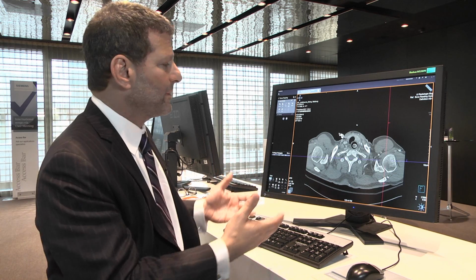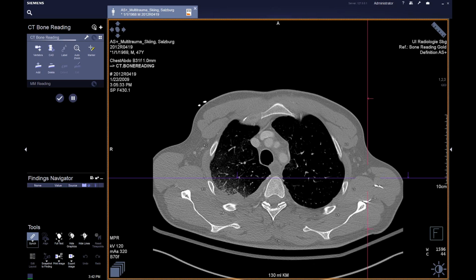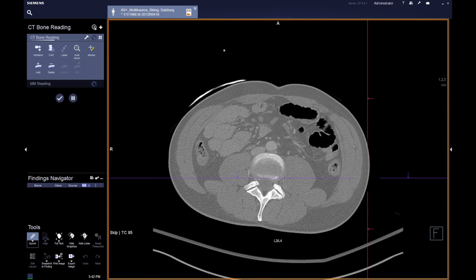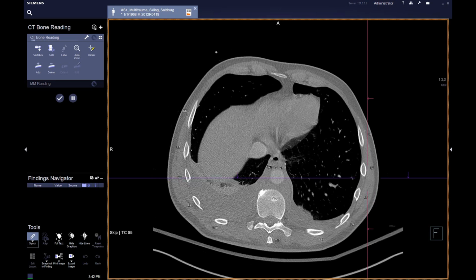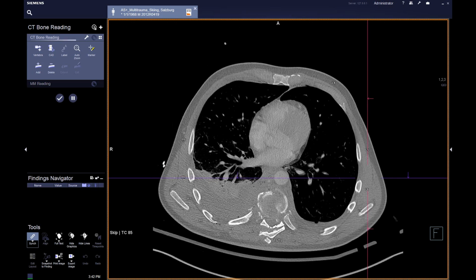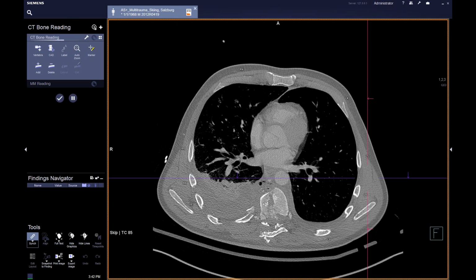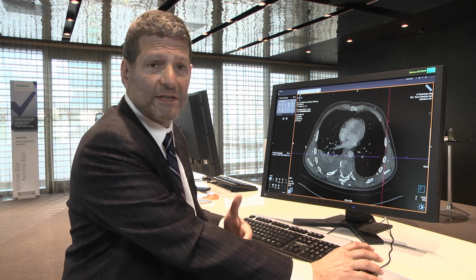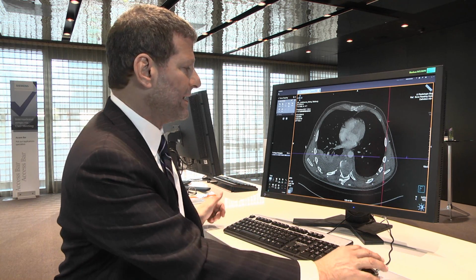You can see the typical approach you might get on a typical chest, abdomen, pelvis CT. In the VIA environment, we can seamlessly slide through the data top to bottom and get our overall view of what's going on. The action appears to be in the chest, where you can see a large pleural effusion. As we scroll through the anatomy, it's difficult to get perspective on all of the individual traumatic changes around the spine. Looking in the axial plane, routinely reformatted images will give you a certain amount of information, but sometimes it's just not in the orthogonal plane that you can get in day-to-day practice.